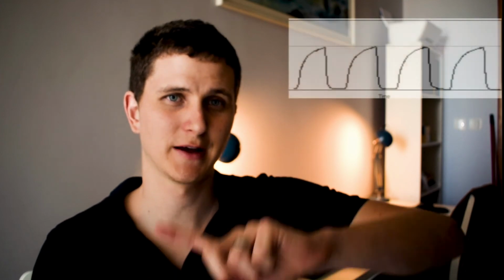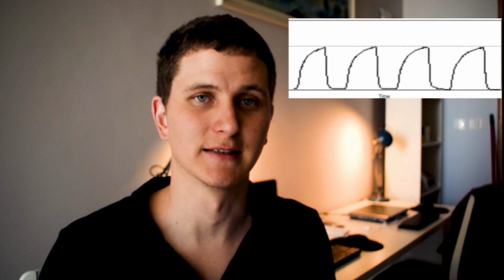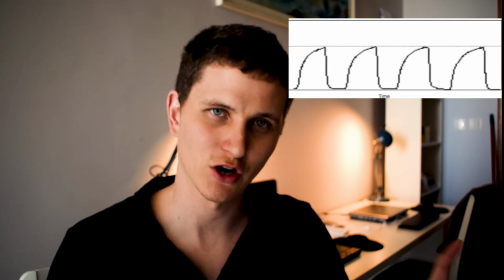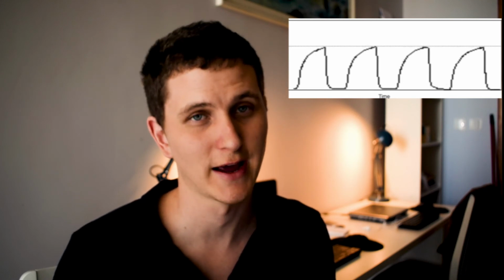The other place where ETCO2 is really useful is asthma. You have these shark fins. It's like a big shark fin, and then it drops. And the reason why that's amazing is because it's super sensitive, and the moment you put it on a patient who's intubated and they have air trapping, like asthma or whatever the case is, COPD, you will see these shark fins, and it's a really good indicator that you need to start to treat for air trapping or asthma.